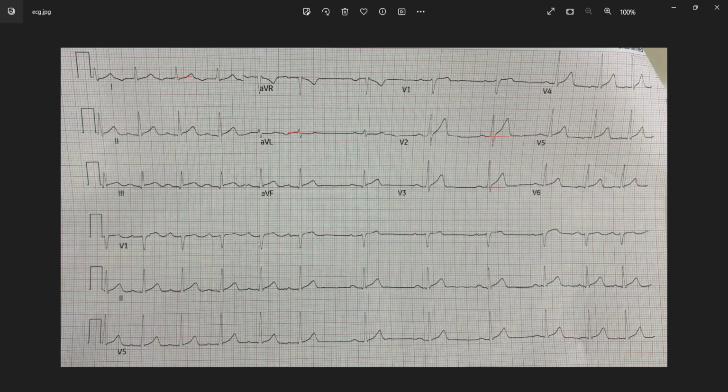Now, one of the things that you have to consider is pericarditis, which is definitely one of the problems that may well be associated with this. The other, of course, is acute ischemia, and a severe acute ischemia as well, which cannot be ruled out in a young person and could well lead to rhythm disturbances like what you're seeing there, because it depends where the infarct may have occurred as well. Then, of course, you look at things like ventricular aneurysms and things like that, which you don't really consider in a younger person, but could well be there in an older person.